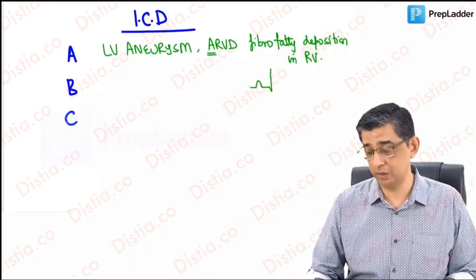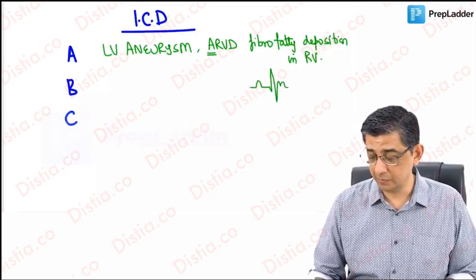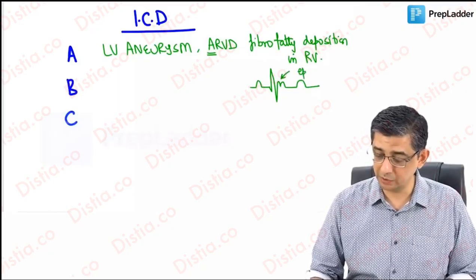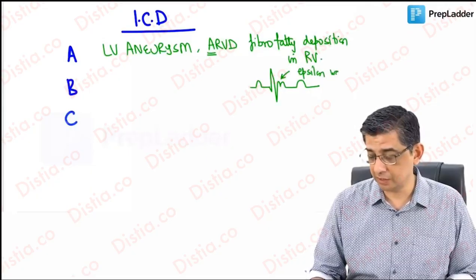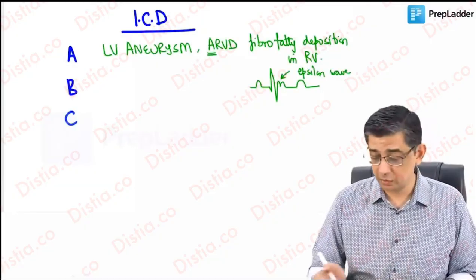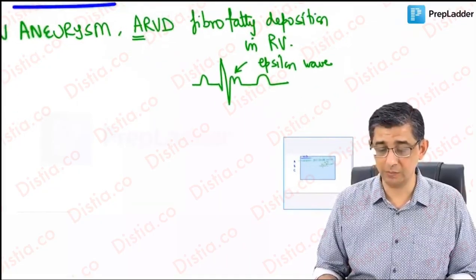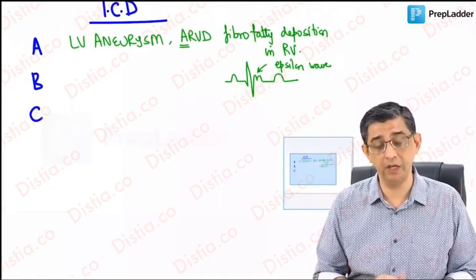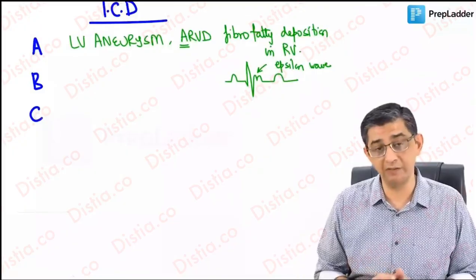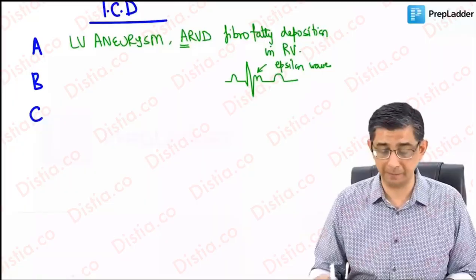In fact, if you do an ECG of a person with arrhythmogenic right ventricular dysplasia, you might be able to pick up an abnormality which is very characteristic and is called the epsilon wave. This finding will be present right where the J point should be. Right in the start I mentioned no isoelectric point. So at the exact area I've just shown, this peculiar wave is present, which is called the epsilon wave and helps you in identifying ARVD. This is obviously if the person comes in advance, when he was symptomatic, when he was having syncopal episodes and you did an ECG which showed this characteristic manifestation.